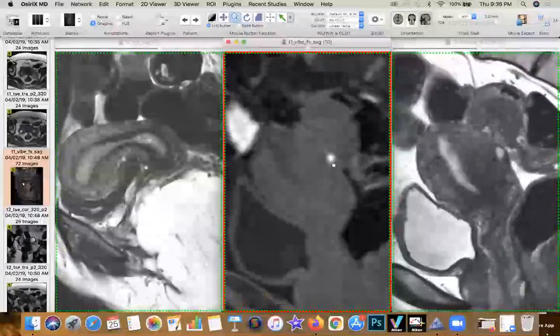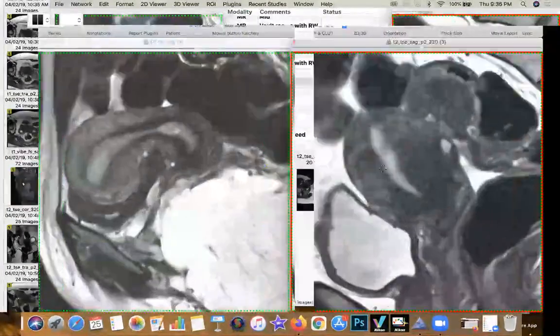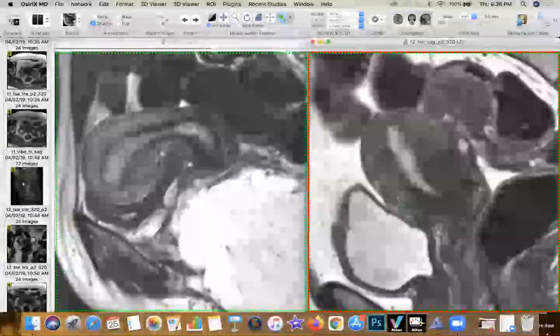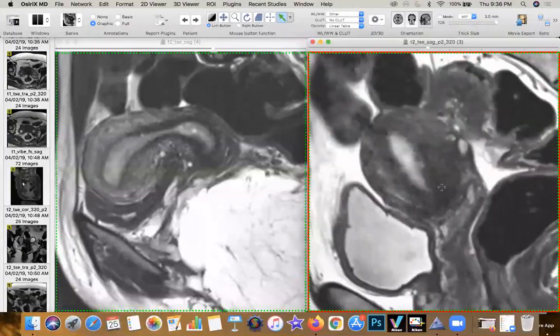So now when you see what's happening, your eye should straight away go to the subserosal myometrium in the posterior wall. That's a normal myometrium which you're seeing out here. You can see the normal myometrial signal intensity, and you can see the abnormal myometrial signal intensity sitting here. Basically, what happens is endometriotic tissue incites a fibroinflammatory response in whatever tissue it sits along with.